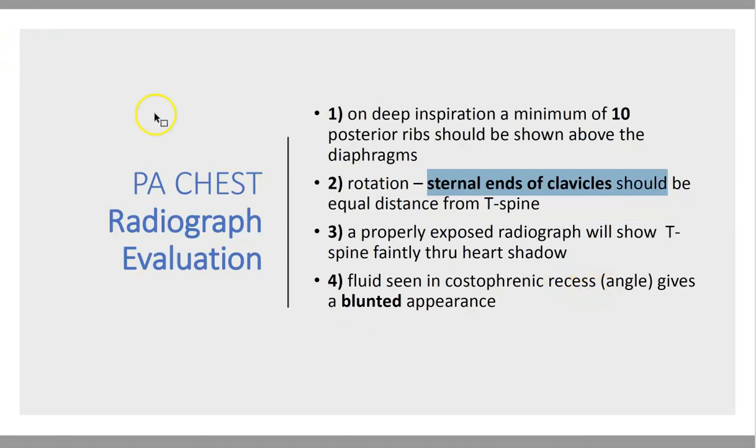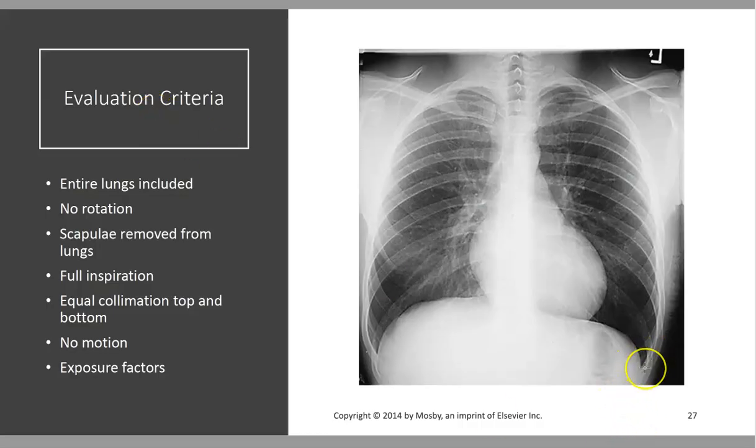angles, as long as they're on the image, which they must be. So here we have our chest x-ray.